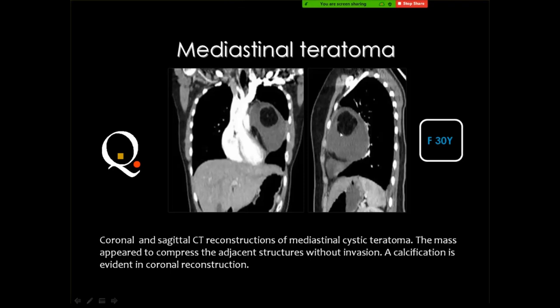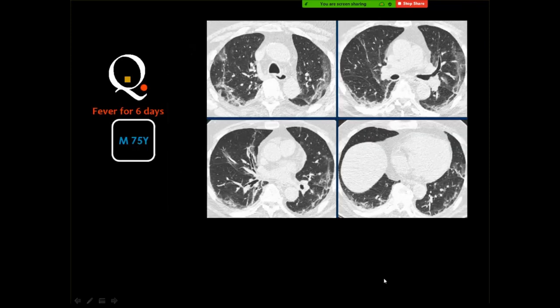If you see fat inside a mass and you are not sure that this is mediastinal pathology, consider it as mediastinal pathology, because there are no masses in the lung containing gross fat, unless extremely rare, and it is usually diagnosed by biopsy.